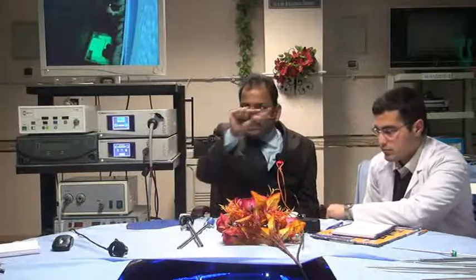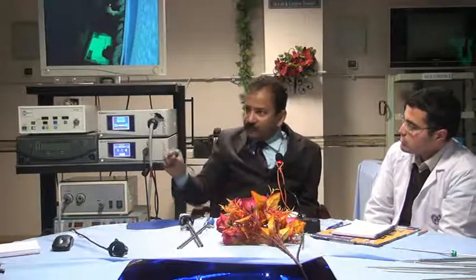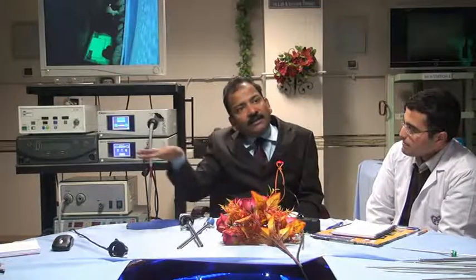Just like in the equalizer in a music system, in the beginning all the parameters are 0. And when you want to have jazz or rock, you pick the bass up, treble down. Isn't it? But from the beginning, if all the treble is down, can it go further down? It cannot. White is in equal proportion. That's why white balancing is used.